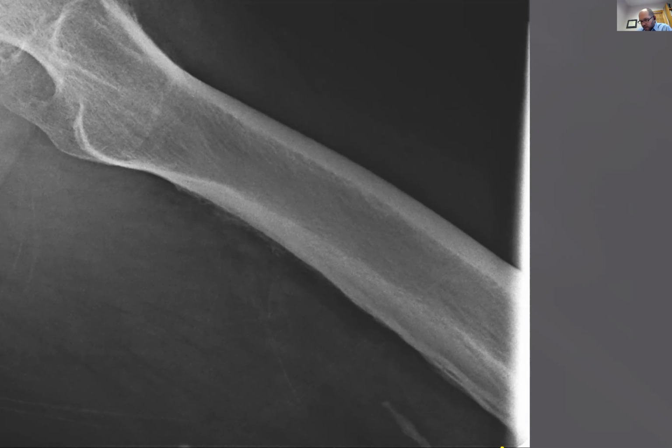This could be an indication, not that you need surgery, of course, but there's been old trauma there, and there's probably some significant adhesions. Perhaps if you work on that, some of the things they're calling hip pain, maybe some of that hip pain is coming from here. And so clinically, that's what I would do.